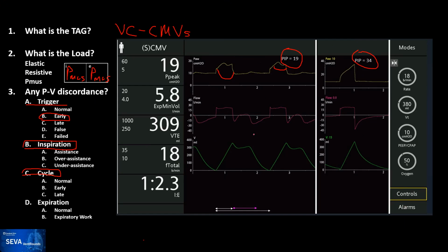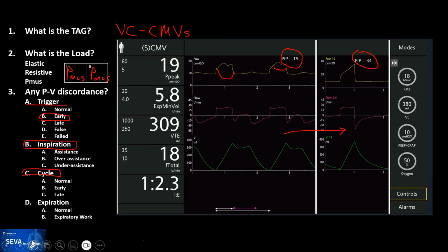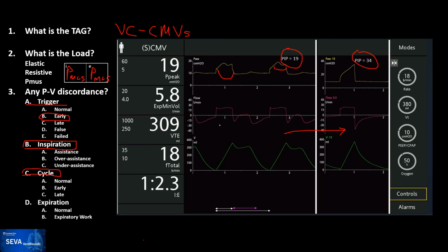There is some sort of scoop on the peak expiratory flow rate, which means that maybe something that happened due to the machine trigger is extending, passing the mechanical inspiratory time. In a few words, it looks like the neural inspiratory time of the reversely triggered breath extends beyond the mechanical inspiratory time and halfway into the expiratory time. Yep, there's your neural inspiratory time.